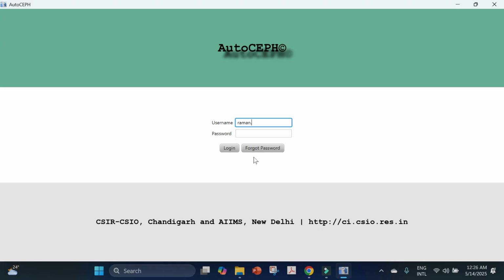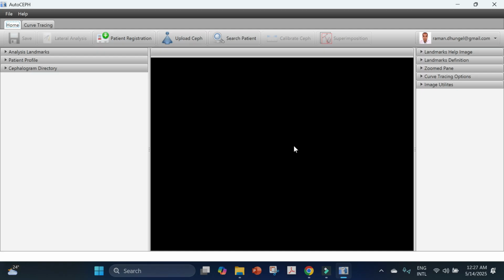Now let's log in. And after you provide the login ID, username and password, username is generally your Gmail account, and to initiate any analysis you need to do patient registration first. I am showing you step by step how to do lateral cephalogram analysis.